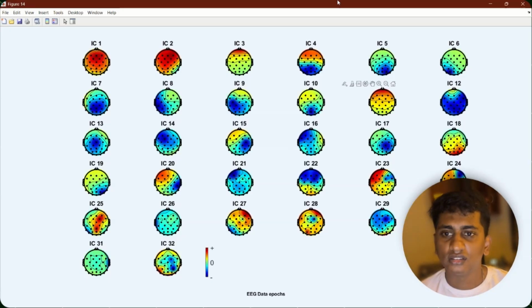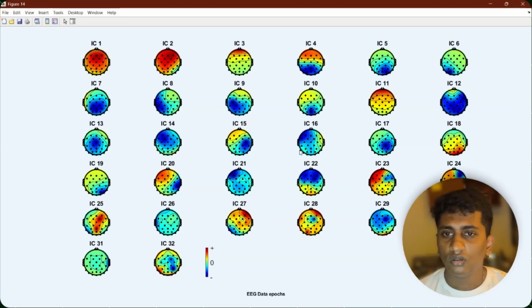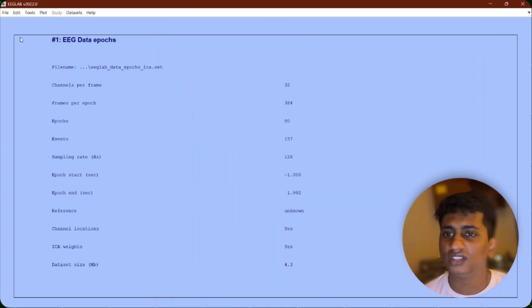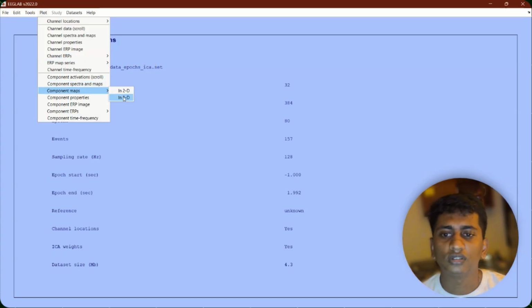Just a second. So as you can see, this is a 2D spectral image processing. You can see all the data here. We'll go for the 3D also. This will take some time for processing.